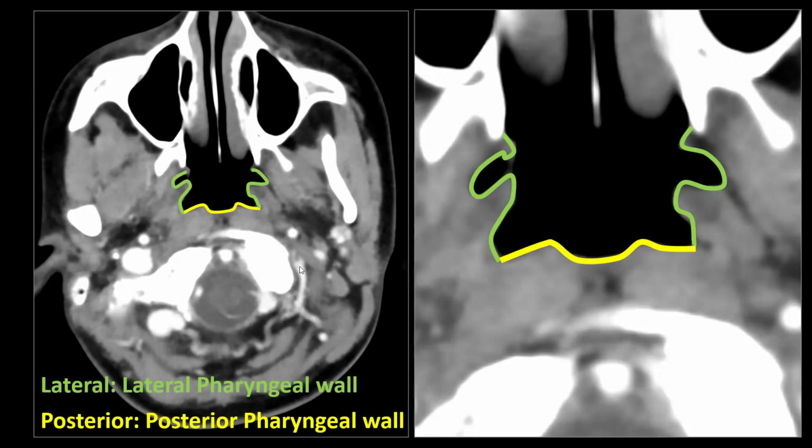Let's magnify this a bit. And what is very conspicuous and always visible on images of the nasopharynx are these elevations or protrusions, or how would you call them? We have one of them on each side, so two in total, along the lateral nasopharyngeal walls. And these protrusions we call the Torus Tubarius, and I'm going to explain in a minute what that is exactly or what is causing it.